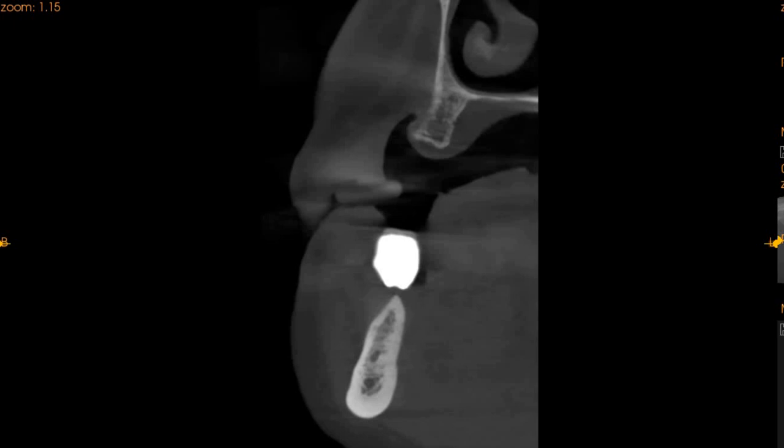This is the one, two, three, and the four first premolar region, and we will now show you. There we go. So this is the first premolar region. We've got approximately 4.9 mm of ridge width at the crest, 4.4 mm of ridge width at the middle, and approximately 10 mm of ridge height. So this can house a very thin implant, 3.3 for a premolar.